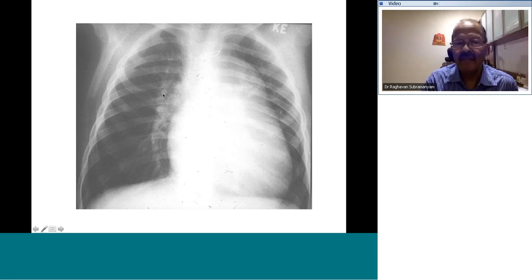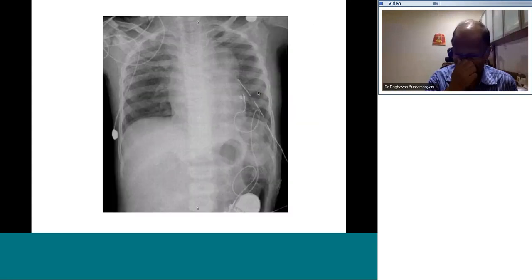But this X-ray in addition shows plethora. The hilar arteries are increased and there are some end-on vessels. Therefore, this could be a congenitally corrected transposition with increased pulmonary vasculature, with a ventricular septal defect. Okay? A lot of this diagnosis of congenitally corrected transposition is made by associated findings, and I'll show you some examples later on in my talk.